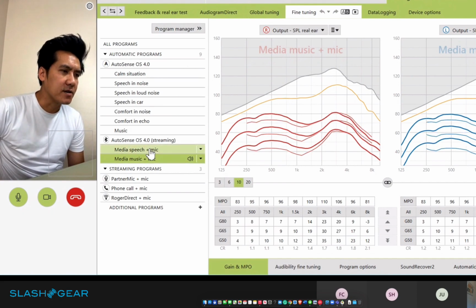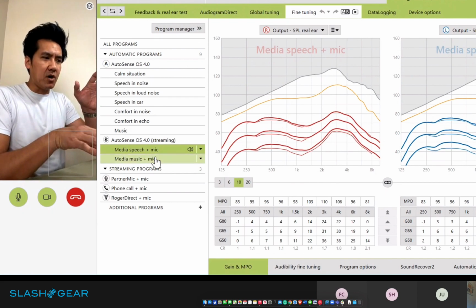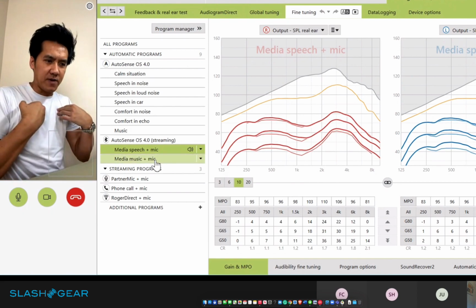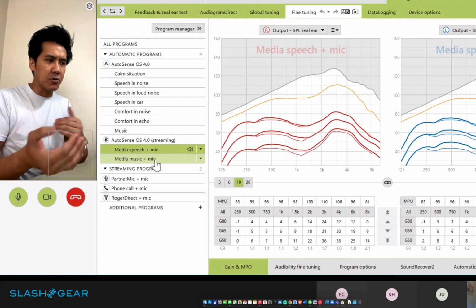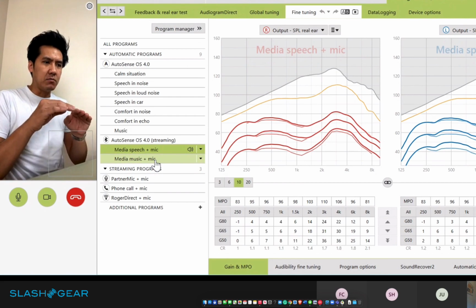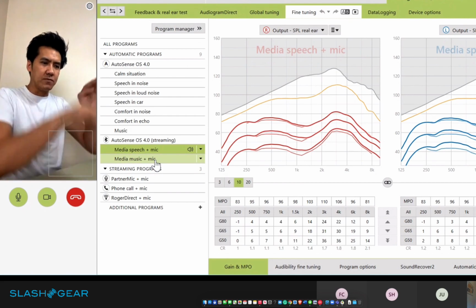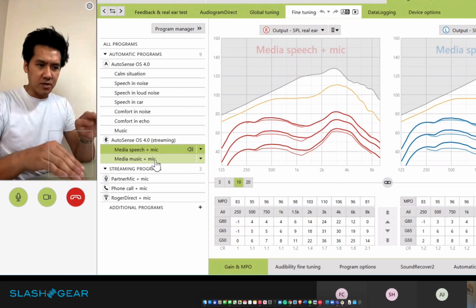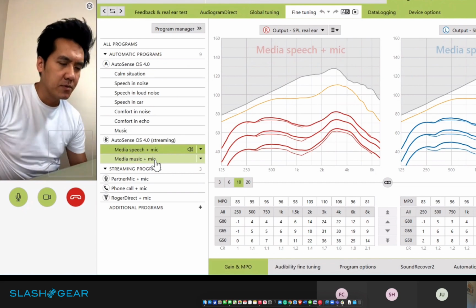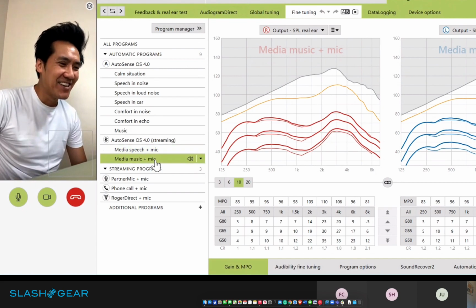Okay. So the frequency is based on my hearing profile. So basically everything I'm hearing through the streaming profiles is based on my hearing losses to compensate in each of those frequencies, if you will. Just so I understand for the write-up. Yeah, no, that's a great way.